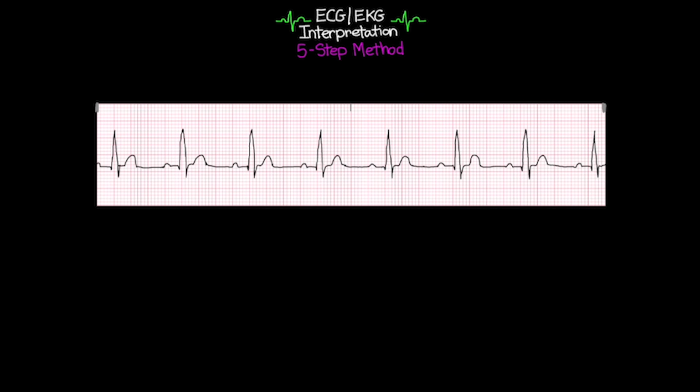And so again, we're going to go to our example here with the 6-second strip. When we're talking about what our patient's heart rate is, what we want to know is how many times the heart is contracting in a 60-second period, or 1 minute. And this essentially gives us our beats per minute. So I'm going to give you guys 4 different ways in which you can look at your 6-second strip here and determine what your patient's heart rate is.